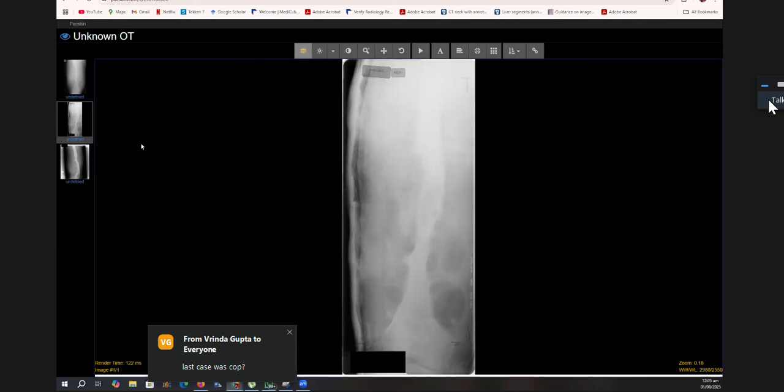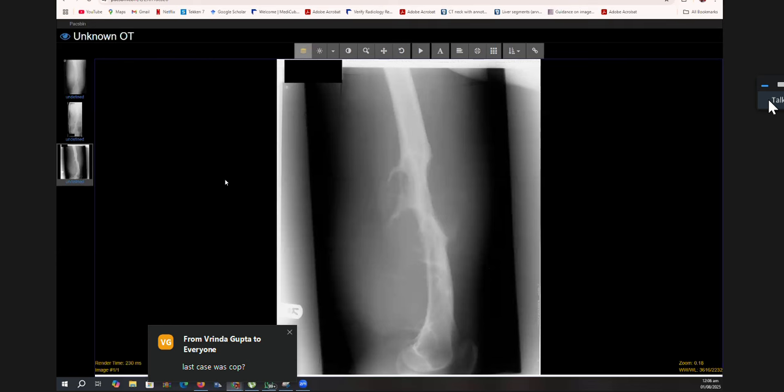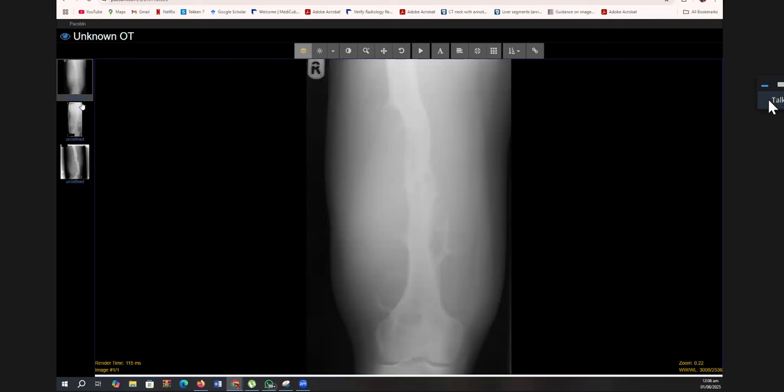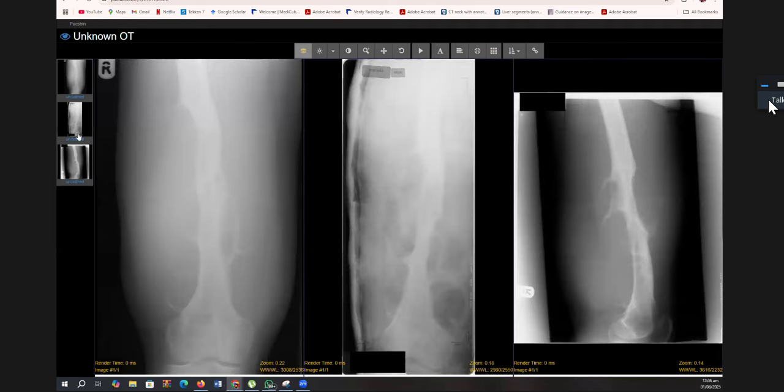Look at the thumbnails 1 and 3. If you go to the change layout, if you go to the grid, yeah, okay, that's fine. So should I start from this one, frontal? Yeah, put them side by side if you can. Go to the change layout, that's it. Put them side by side. Yeah, that's fine, perfect. You've got it.